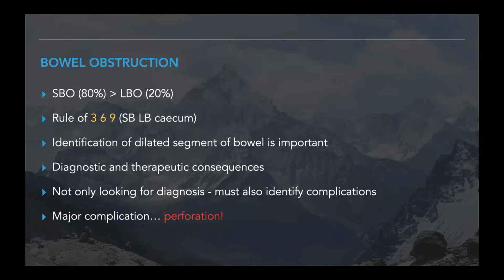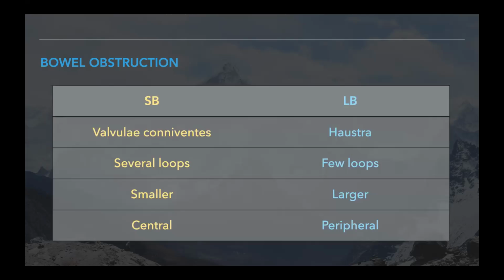It's important that you identify the dilated segment of bowel, i.e. whether it's small or large, because that has important diagnostic and therapeutic consequences. And remember that you're not only looking for the diagnosis, i.e. small bowel obstruction, you're also looking for complications. And the major complication of obstruction is perforation. We'll discuss the findings of perforation later on.